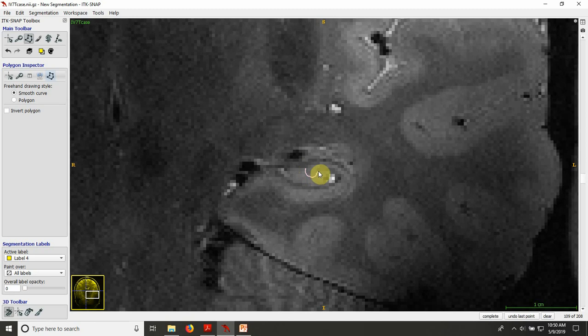And then I'm going to circle back to this endpoint of the SRLM and then outline it like this. I'm going to add this voxel here, and then just add these 2 as well. So now, after this, I'm going to adapt the CA2, CA3 border.